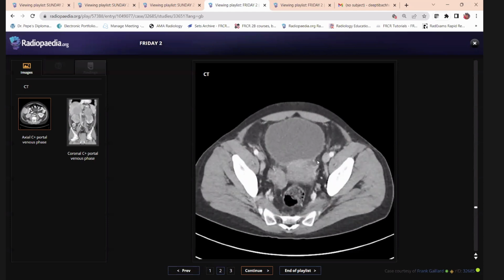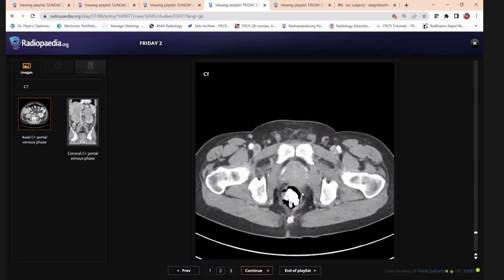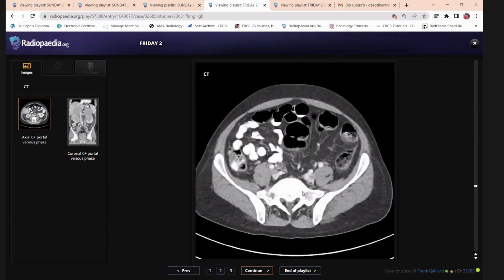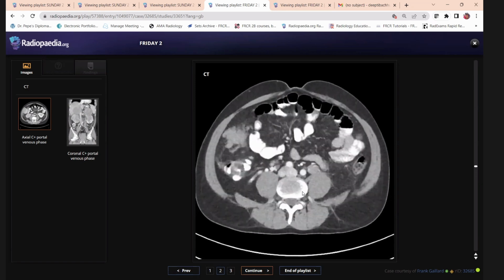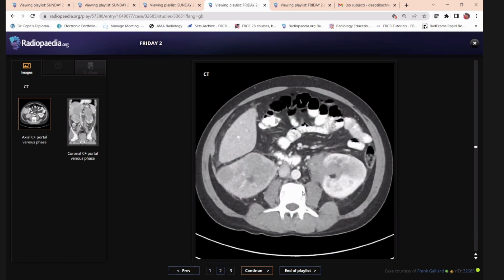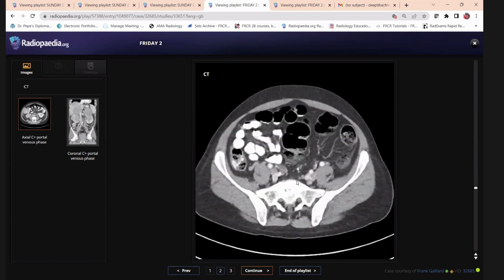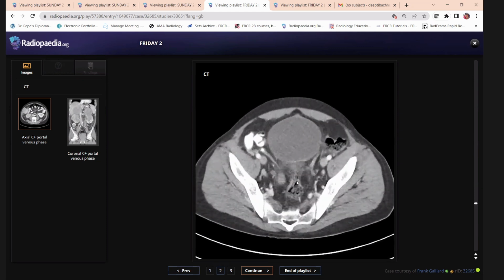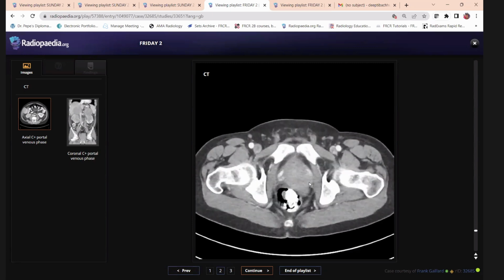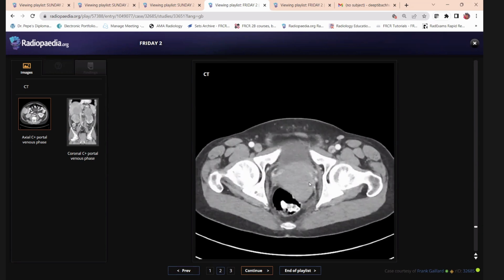We said that the patient presented with bleeding, so I'm trying to see if there are any colonic masses. There are a few enlarged lymph nodes I can see as well. Go to the pelvis. There's something in the pelvis. Yeah, I saw there was a uterine, I think this is a uterine. Are you sure it is uterine? No, sorry, this is a male patient.